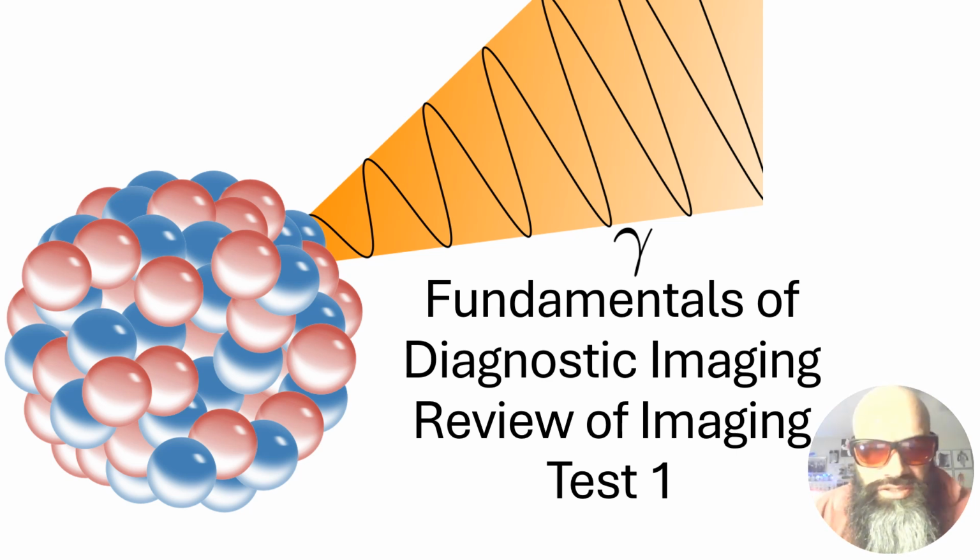Hello students, and we're going to go over several chest x-ray imaging examples today and go over some of the pathologies associated with them. Let's get started.